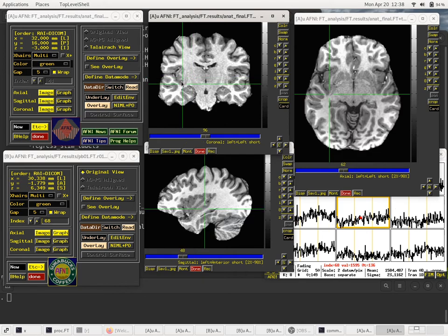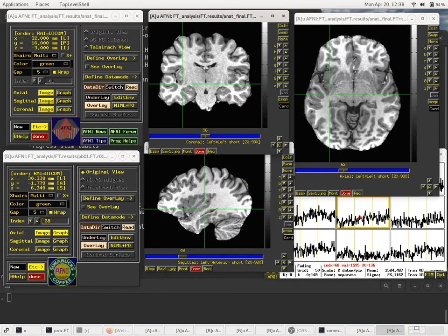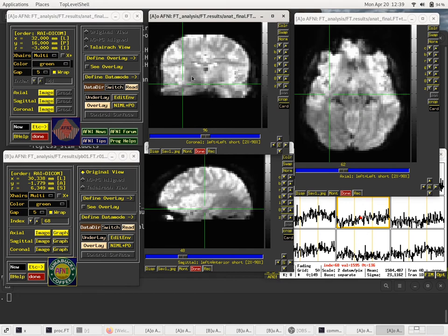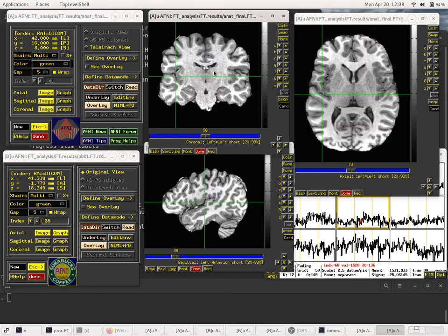Just bouncing a couple other places. If we go over here, we should see this area be bright, so a bright area coming here and then curving around. Yeah, we see a blob there. It's not perfect. Right in here, it ought to be bright, but there's a dark spot in there. No, that's just a different tissue. I don't know what the actual tissue is in there. Here are the ventricles. We have some bright spots right there. That looks good. Over here, I'm not even clicking the mouse, I'm just putting the mouse somewhere to direct your eyes. This blob over here.